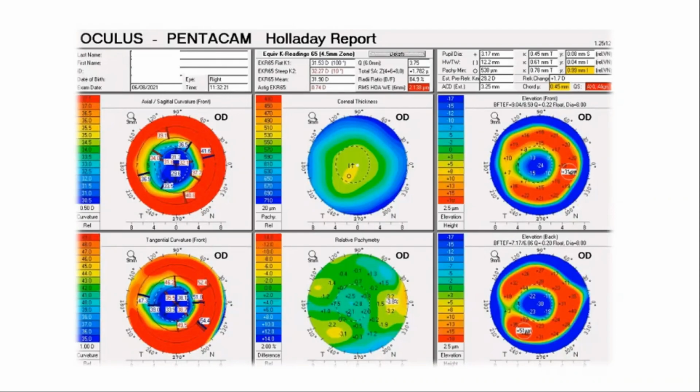But I'm just wondering, if we had a healthy normal eye and there was some significant abnormality of the posterior corneal astigmatism, or posterior corneal measurements or keratometry, how would that look on these maps? When we are looking at it, how would we know that this is not a healthy posterior corneal measurement and this one is a healthy corneal measurement, for example? How would you differentiate? I'm just thinking.